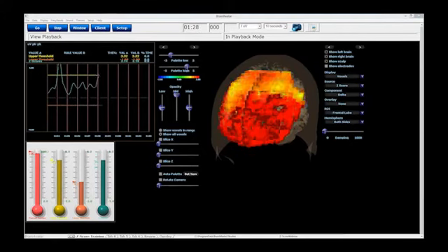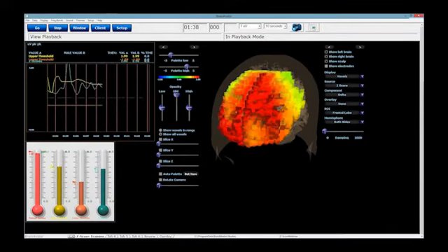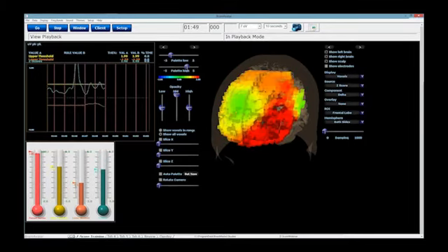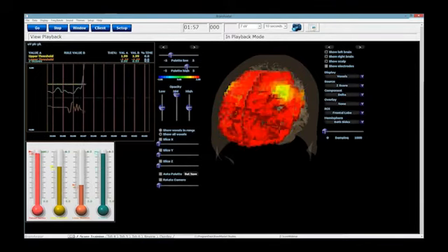Now you're going to notice that the same controls apply in this one right here. Upper and lower: U key, Shift U key, and then we go right here, lower with the L key. Shift L is going to bring it down like that. It's going to bring it up like that. Or drag it up and down.